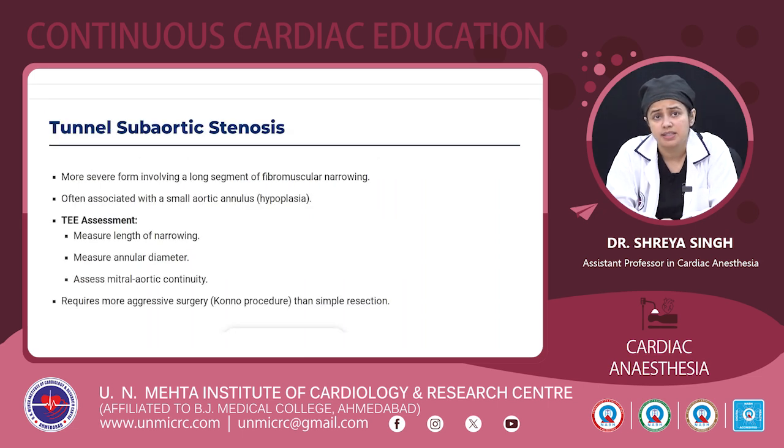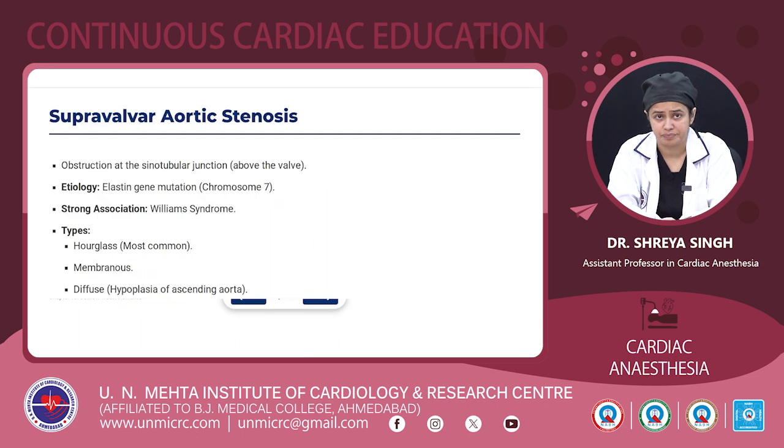Then we have the tunnel type of subaortic stenosis. It is a more severe form involving a long segment of fibromuscular narrowing, often associated with a small aortic annulus, hypoplastic. So on TEE assessment, we can measure the length of the narrowing, the annular diameter, and also the mitral aortic continuity. This requires more aggressive surgery, usually a Konno procedure, rather than simple resection.